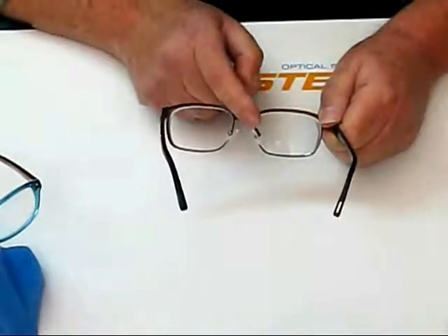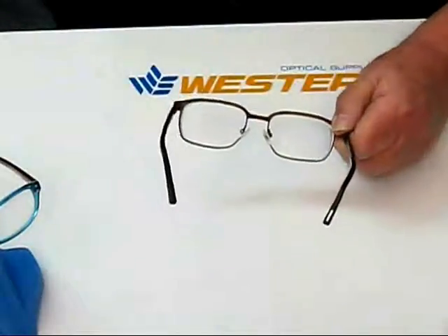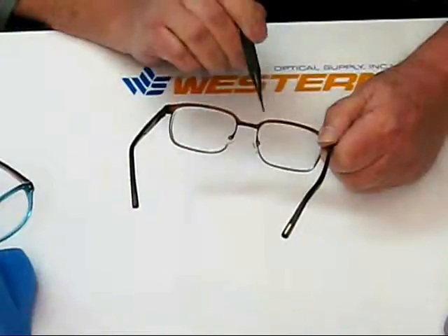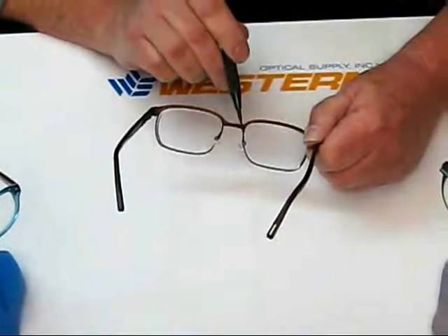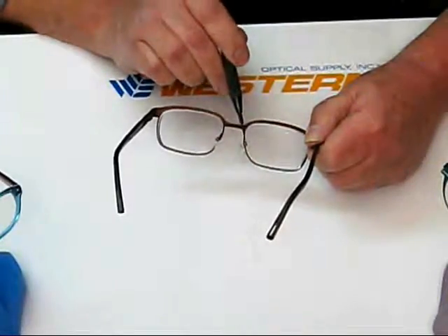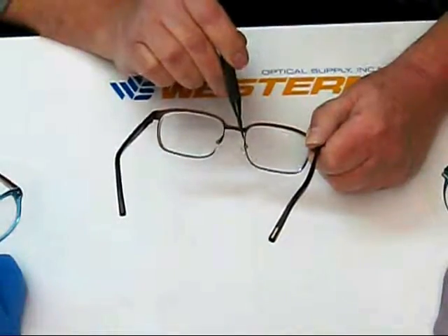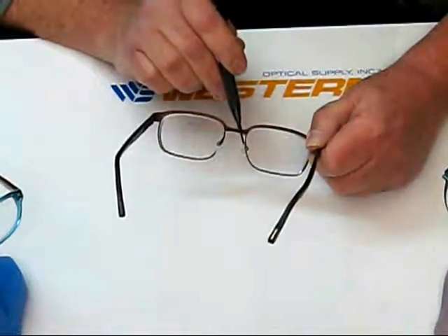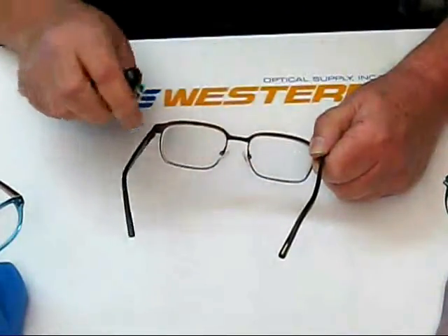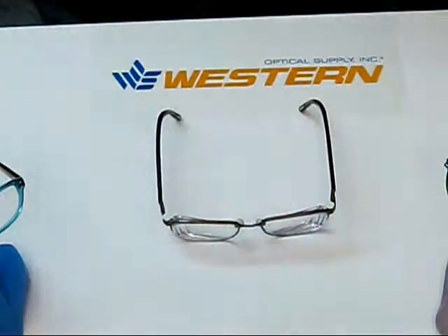and you have the nose pads, usually silicone, that are attached to a nose pad box, and that nose pad box is attached to the nose pad arm, which is the actual part that gets adjusted to match up with the individual's nose. And the nose pad arm in turn is attached again to the back of the eye wire. So this is the anatomy of an eyeglass frame, and there are very few variations on that theme.